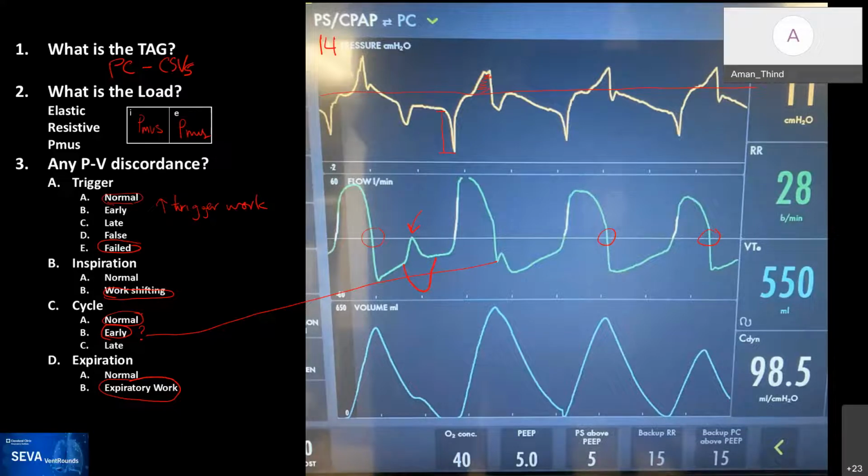That'll cause the drop in airway pressure, which just reaches the baseline at one small instant, but the drop in airway pressure is over a longer period. Normally, even in the last case where you saw a missed trigger, it wasn't a huge deflection in the airway pressure waveform.